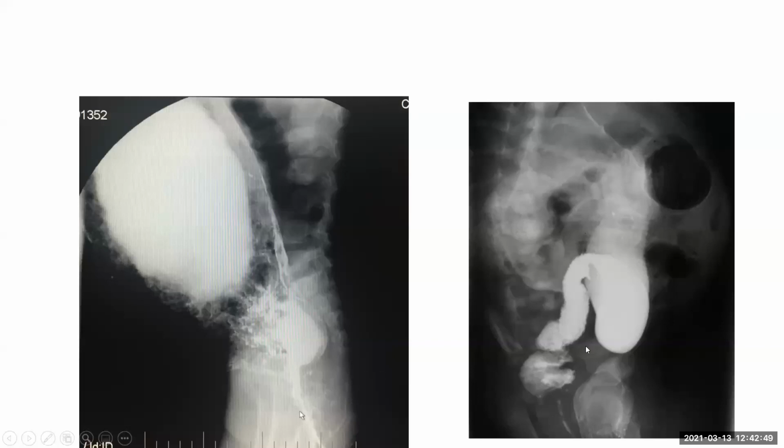Sometimes, and many times this happens, the history is very typical, and when the surgeon does a PR for this patient, there's a gush of stool coming out, and they have a very strong suspicion that it is Hirschsprung, but we don't see it on the barium enema. It looks quite normal. Those are the times when we do the 24 hours film. And if there is retention of barium, then we also give the suspicion, and we definitely have to go for the rectal biopsy, because there are sometimes very short distal rectal segments involved, and we can hardly see them on barium enema.